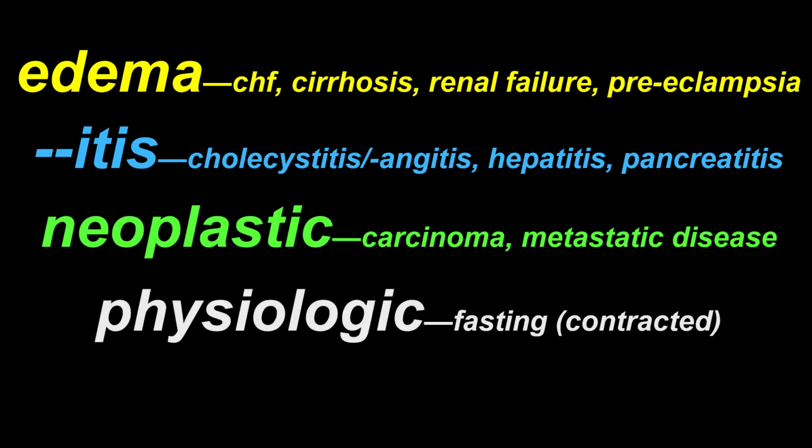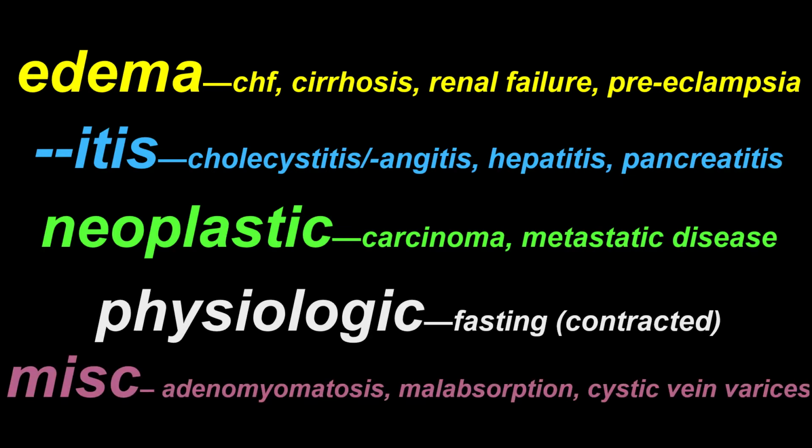There are also a few physiologic reasons why the gallbladder could appear thickened, and fasting is one of the most common reasons. And then last is this other bucket, where I think of adenomyomatosis or malabsorption or cystic vein varices, but these are a little bit more rare.